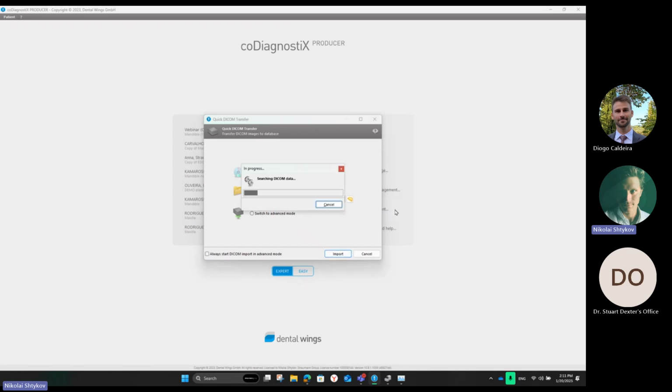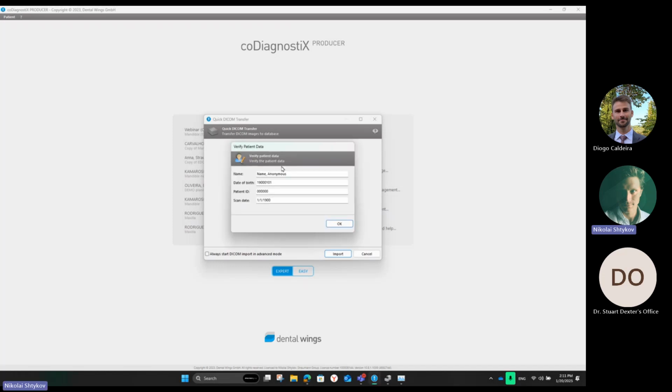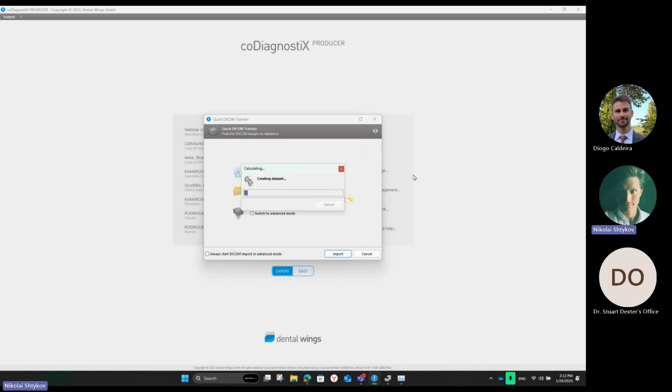We click import. Waiting a little bit. And here I can change the patient name or I can leave it. For example, I will name it webinar 20 of January and click OK.